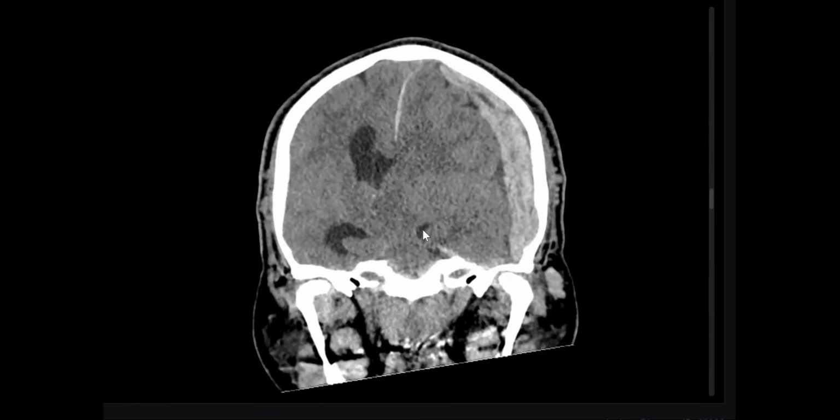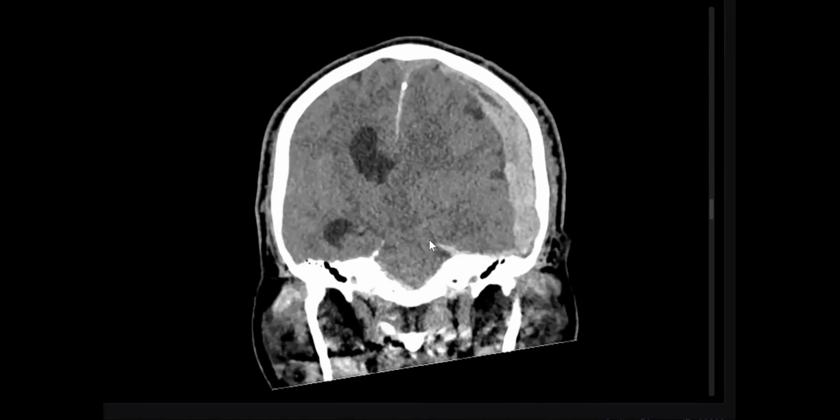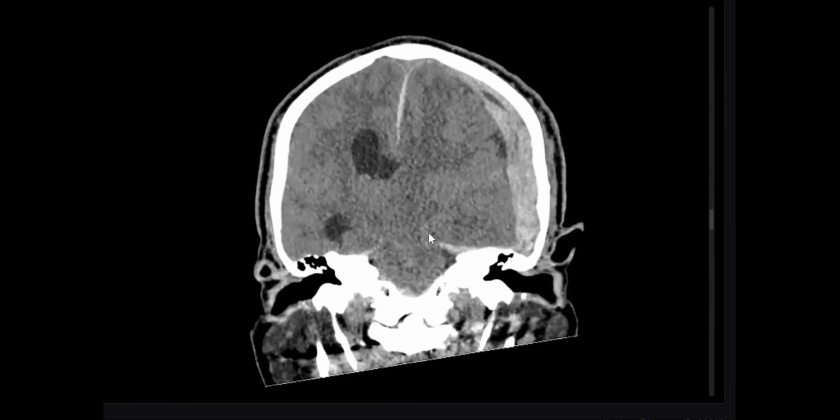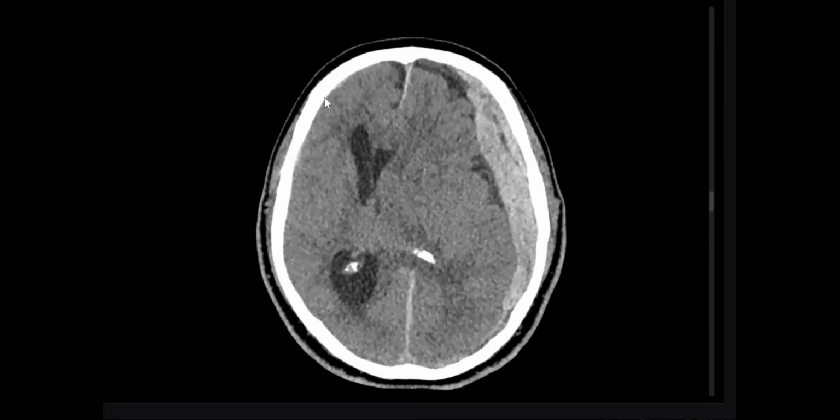And if this is the temporal lobe, so definitely the uncus will be crossing the midline, and it's compressed against the tentorium. It's another type, transtentorial herniation. And remember, tonsillar herniation can occur, but mainly with posterior fossa lesions.